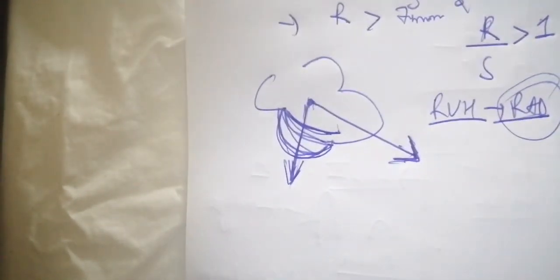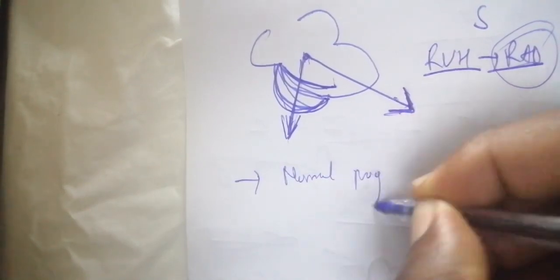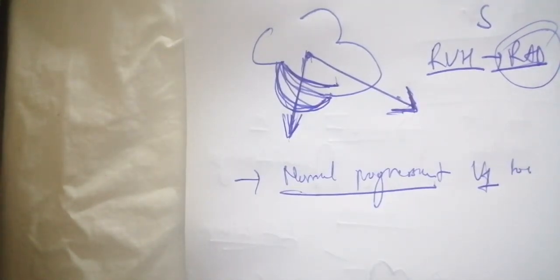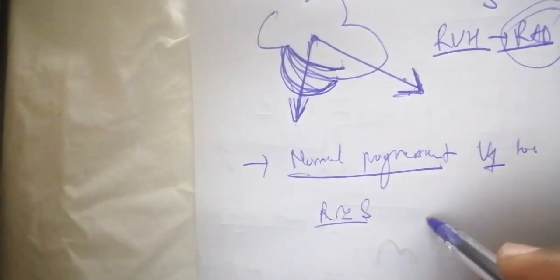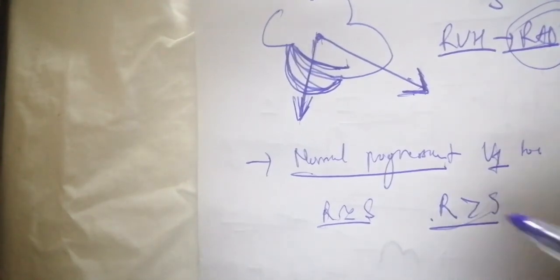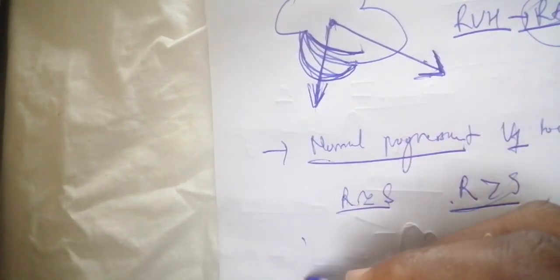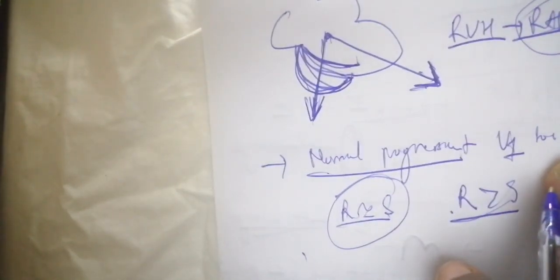And lastly, another sign of right ventricular hypertrophy concerns the normal progression of the leads from V1 to V6. V1 and V2 have the R wave amplitude less than the S wave amplitude. V3 and V4 have the R wave amplitude approximately equal to the S wave amplitude, and V5 and V6 have the R wave amplitude greater than the S wave amplitude. In a case where you instead have an inversion, where at V1 and V2 the R waves are greater than the S waves, it is not the normal transition. It can also be a sign of right ventricular hypertrophy.